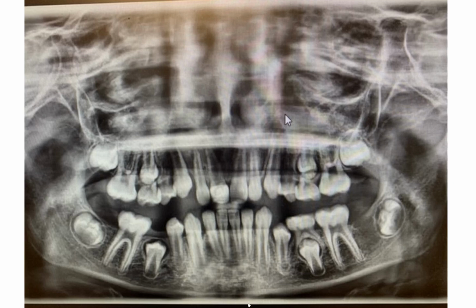This is Dr. Kim. Today we have two panoramic radiographs taken 2 years apart. This is the first set of our first image when the patient was 10 years old.